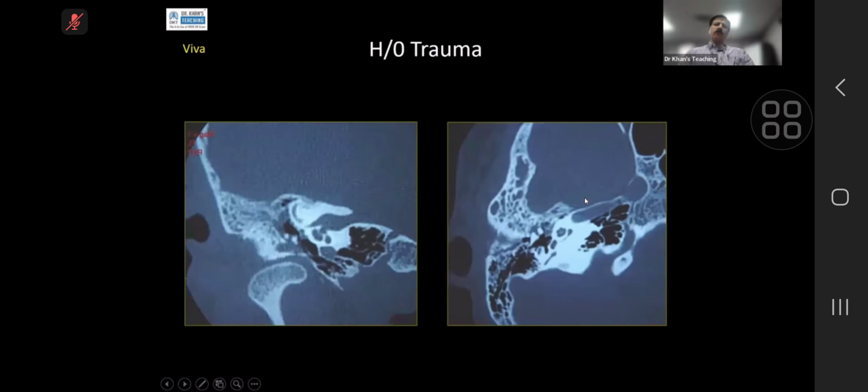Okay. In the trauma world, always beware of temporal bone fractures as well as ossicular dislocations whenever you are reporting a CT scan, particularly in the exam. Please remember, at the level of the epitympanum, the head of the malleus sits here with the body. We call it the ice cream cone, so it should be sitting here.